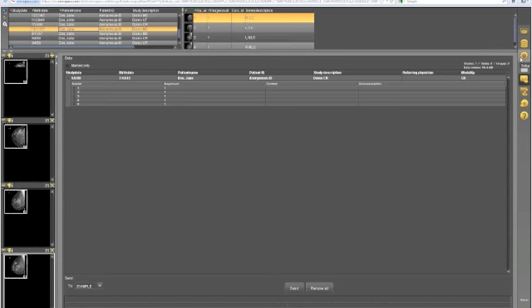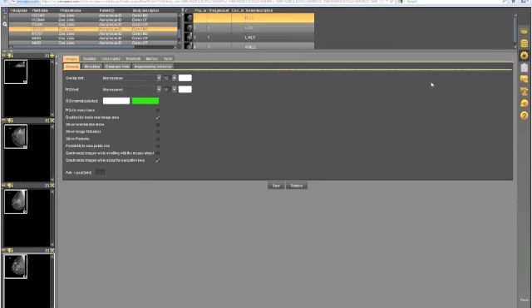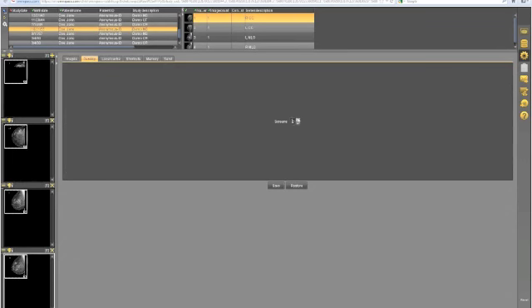One of the other key tools here is for viewing. If you're working with a radiologist or you are a radiologist, there's a configuration. You can pull this up in 2 monitors. So on the right, we've got the view area, and the number of screens that you can use is 2. You can keep the RemotePACS work list open in a 3rd monitor if you'd like. It will work on diagnostic grayscale, 2 and 3 megapixel monitors. It is FDA approved for that. Mammography, it is not FDA approved, but it can be used for reference.